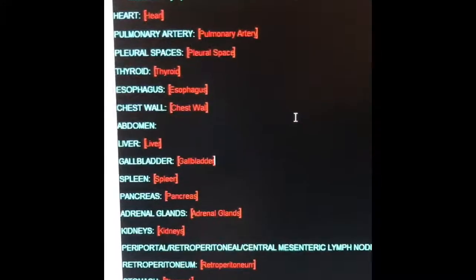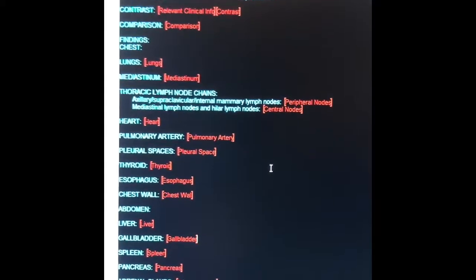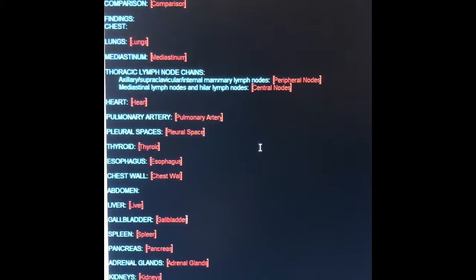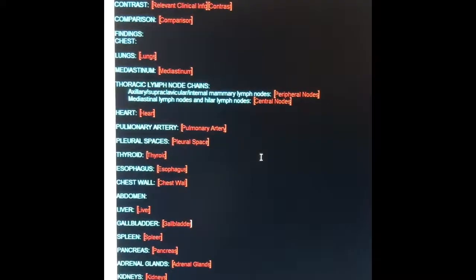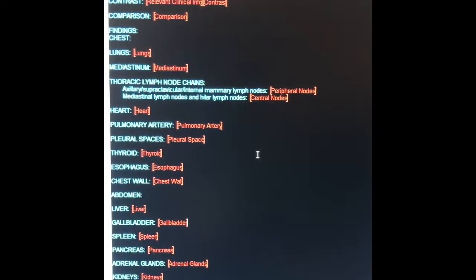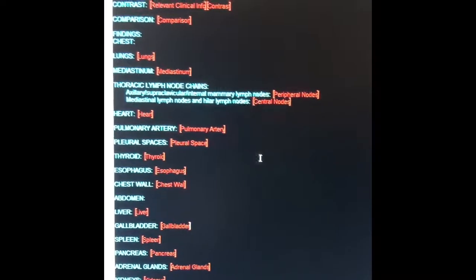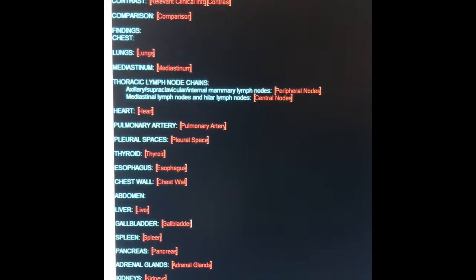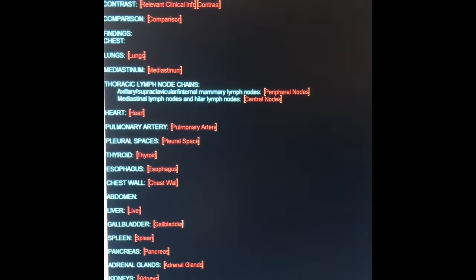So this is a CTA TAVR. This is a study that would often take me 20 minutes or more to read. I can read this in 8 minutes if there's nothing crazy and just a bunch of chronic things, because all those items will pop into the field so quickly. That's it for the description of that. So you'd save your changes and then you close, and next time that field pops up, it will ideally work like you want it to work.